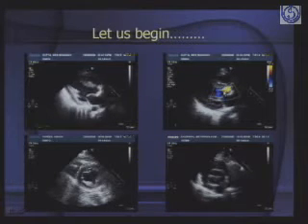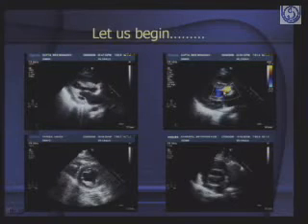Now this is not a very good way of assessment of aortic regurgitation, but at least in the beginning you know that yes, I'm dealing with a predominant aortic regurgitation.